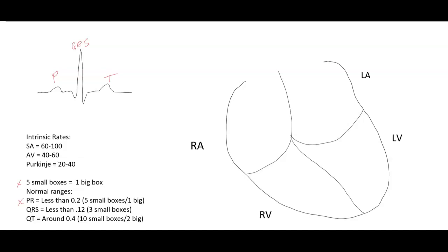And when we're saying that, we are counting from the top of that QRS complex or that R wave, and we're kind of marching those out. Do they seem regular, equal distance apart? And then again, do we have P waves? Do they look normal? Do we have a normal looking QRS, and a normal T wave? And if all of those things are a yes, then it is normal sinus rhythm.